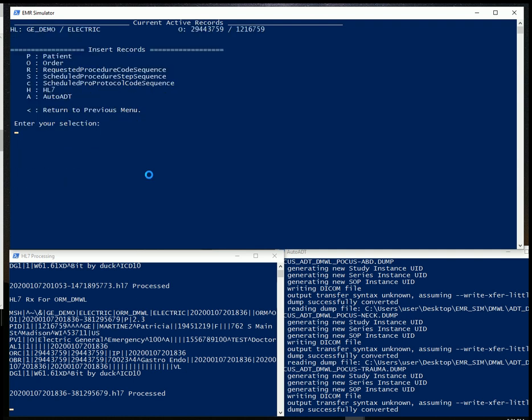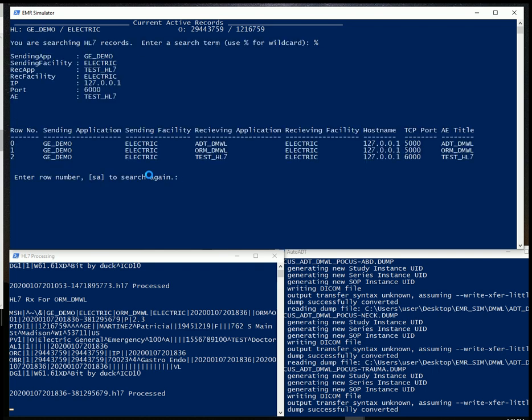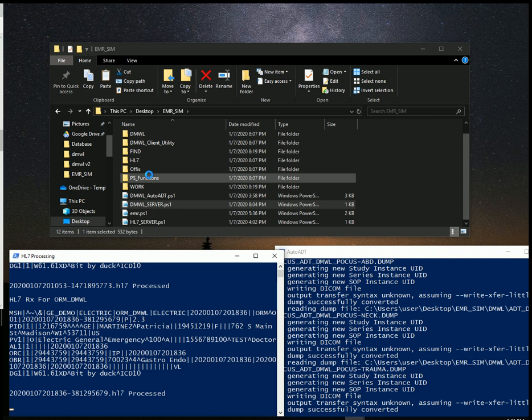That's it. So if I go and do a search on HL7, you can see my other records in there, right? When you're done, we'll go back. I'll hit Q to quit. That's it. I'm out.